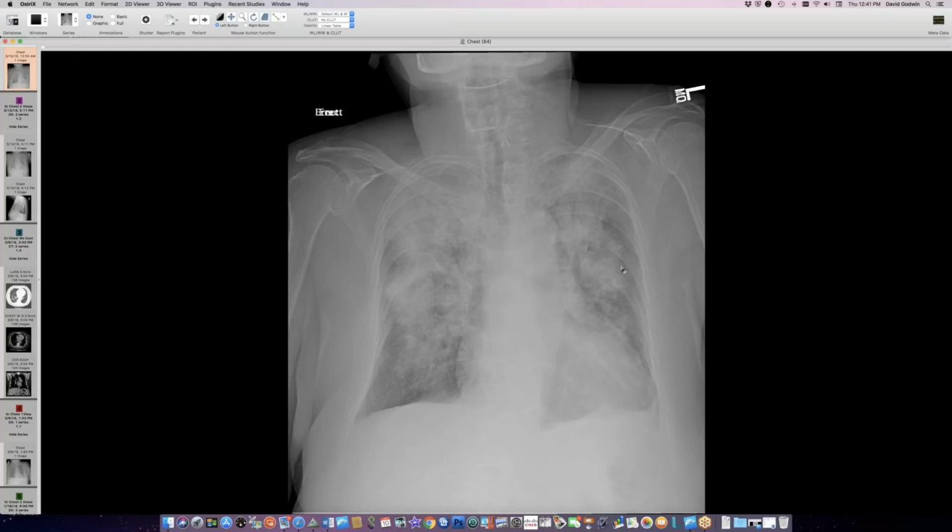So this is EGPA, and I'm showing you this case partly because last week I showed the 20-year-old guy who was supposed to have EGPA. He had a diagnosis of EGPA, but he had findings of lymphadenopathy. We're now pursuing that case, and I will post it if we get the diagnosis of mononucleosis, which I suspect we will. So the lymphadenopathy case last week is probably a different disease, even though the guy does have EGPA. This is pretty well documented EGPA, despite its being ANCA negative.